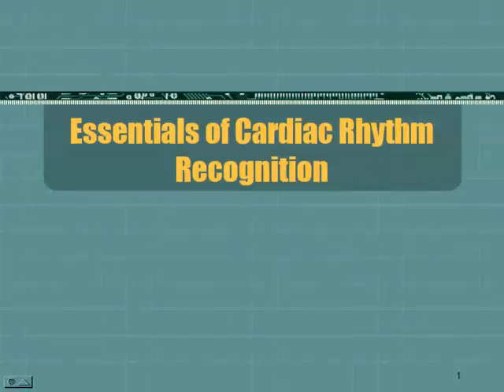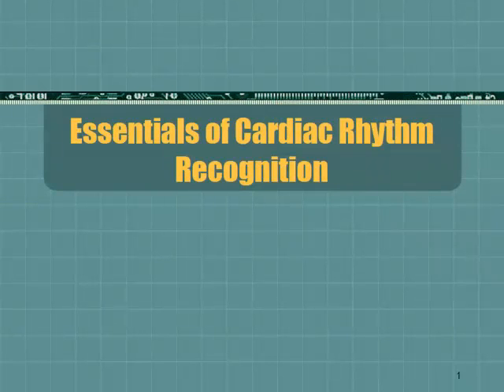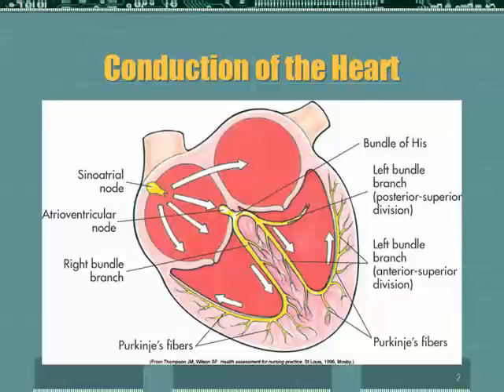The last segment of the cardiac lecture will cover essentials of cardiac rhythm recognition, which is ECG rhythm interpretation. This first slide looks at conduction of the heart.